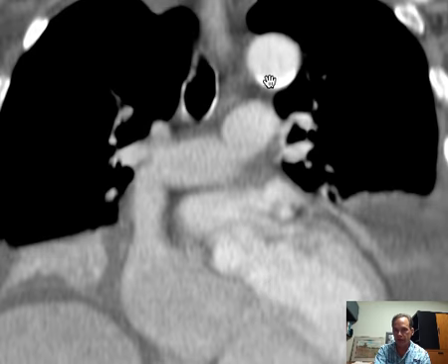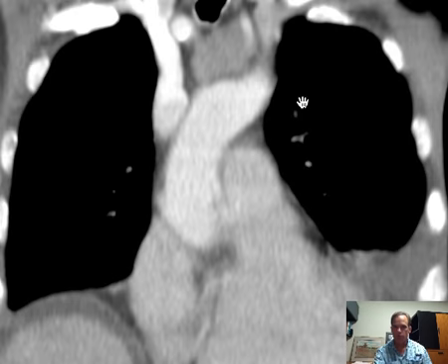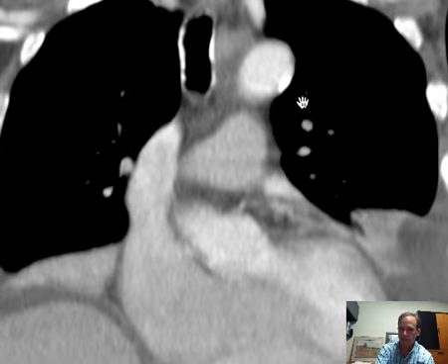So follow the aorta back, aortic arch, and you look under the aortic arch, you have the branching, kind of Y branch, of the main pulmonary artery, forming the left main pulmonary artery and the right main pulmonary artery. So if this is the aorta coming up and over like that, this is not going to be a very good demonstration, the main pulmonary artery comes back and then divides in both directions, right and left, under the aortic arch. So just remember that, and I think you'll be safe in analyzing which is which.